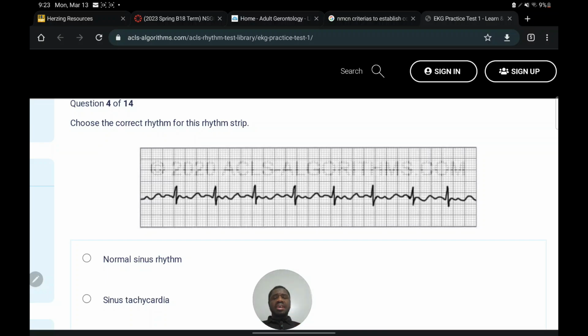So this graph, does it have T wave? We cannot say if it has T wave or not because it looks so mixed up. So we can say that this graph is showing more P waves. You can say that this P wave is not followed by QRS complex. You can see there are more P waves, 1, 2, 3, 1, 2, 3.